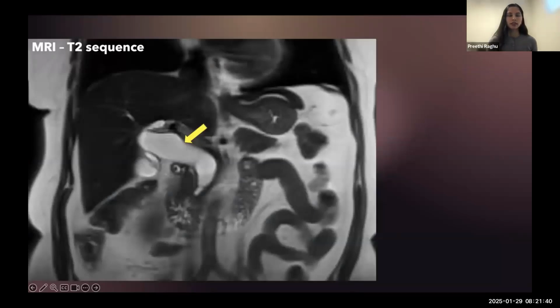Okay, and then staying on this theme of dilated ducts, dilated gallbladder, this is a T2 weighted MRI sequence where we did not see any sort of obstructing stone. If there's a stricture at the ampulla, we really wouldn't see anything by imaging typically, unless there's associated mass or infection. So really, in this case, the only thing we saw was this very, very patulous bile duct in a fairly young patient. And nothing intraluminal and nothing along the wall.